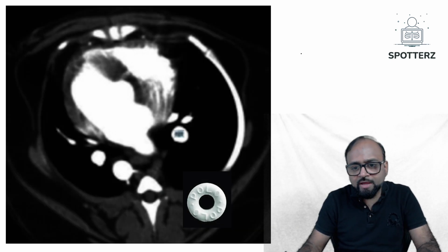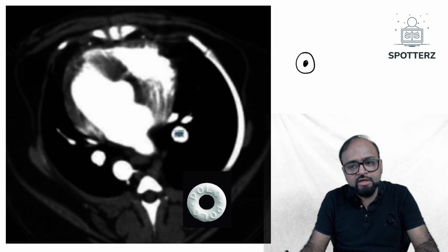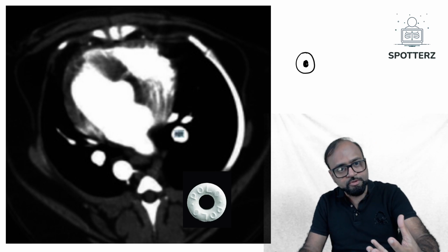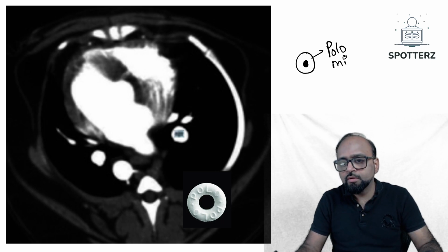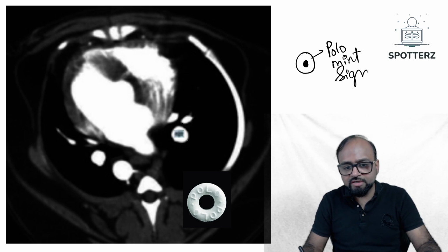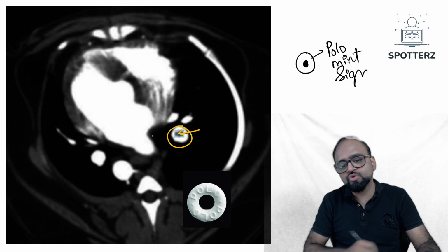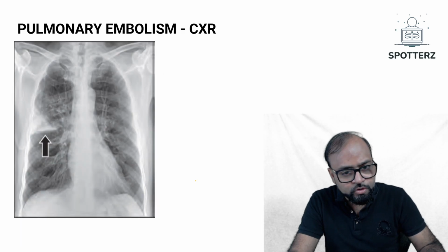Now see, sometimes what happens is within the artery there is a thrombus which is lodged in the middle of that artery. So that thrombus does not enhance, but the arterial lumen around that particular thrombus, as it gets filled up with contrast, appears hyperdense. So this appearance is what is called the polo mint sign of pulmonary embolism. As you can see here, this is an artery, and inside that artery you are able to see the thrombus. So this appearance is called the polo mint sign or polo mint appearance in pulmonary embolism.